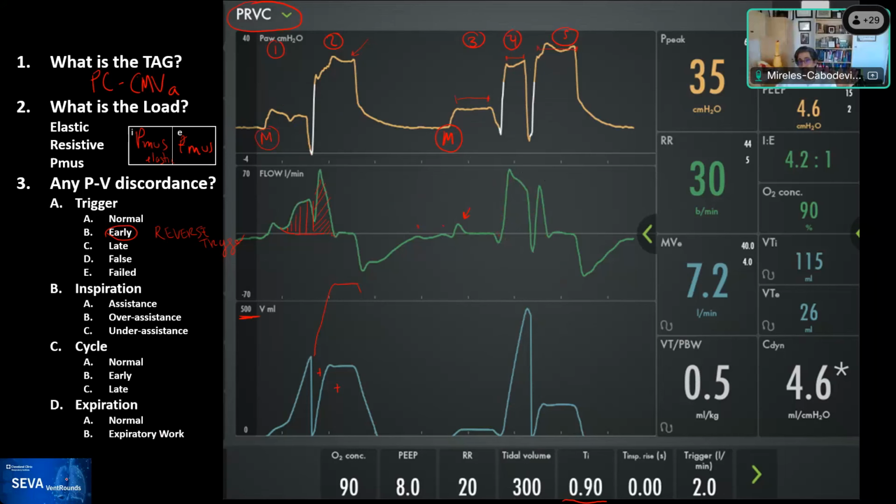Thinking that obviously if the patient is passive, there's no PMUS, so it will require more inspiratory pressure or less. So that's why it uses two different algorithms. So the intelligence in the algorithm that was built in, because if you trigger, meaning that there's PMUS, and you don't trigger it, ensuring that you are achieving the target tidal volume, can play out in a very bizarre way, as you see here, with very tiny breaths delivering very tiny tidal volume, and very large breaths delivering a very large amount of tidal volume for these patients.